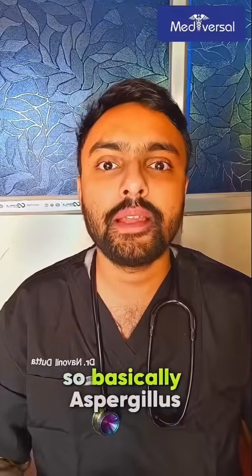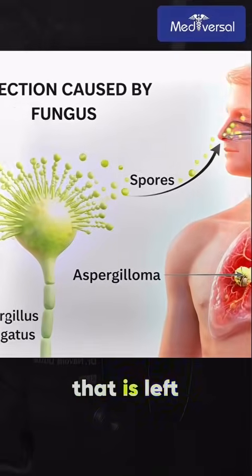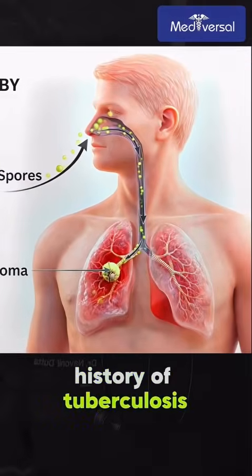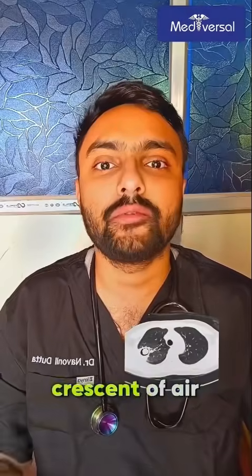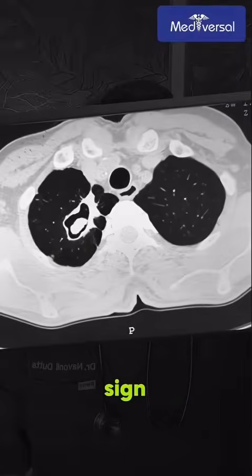So basically, Aspergillus fumigatus colonizes the area of cavitation that is left by a previous or past history of tuberculosis. That is what shows us the opacity and the narrow crescent of air in it, which is sickle-shaped and hence also called the Monod sign.